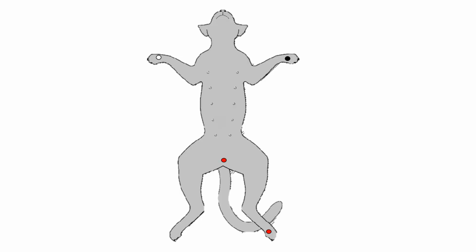Before we plot the leads, a note on the orientation of the electrodes in the diagram. The red electrode is in reality attached to the left hind limb, but in the diagram it's represented on the caudal abdomen, as this will line up with the position of the limbs when the animal is in right lateral recumbency. There are three standard bipolar leads.